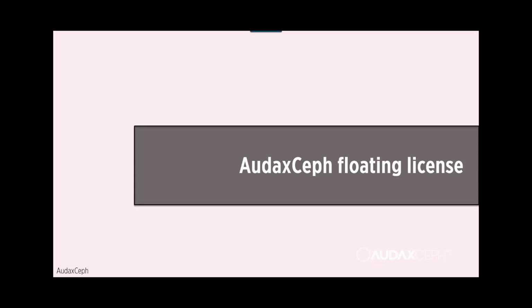I need to tell something about licenses inside the AudaxCeph. So this is a short presentation of floating license inside AudaxCeph.